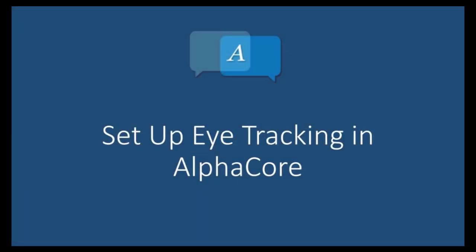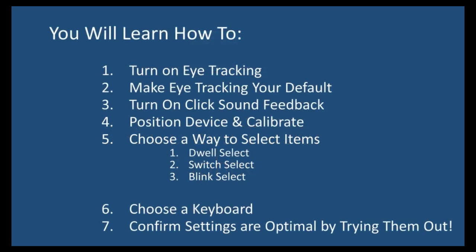Setting up eye tracking in AlphaCore. Hi, I'm Amy Roman. In this video, I will guide you through the initial setup of eye tracking access in AlphaCore. For daily eye tracking setup and positioning, refer to a separate video entitled Caregiver's Guide to Eye Tracker Positioning.